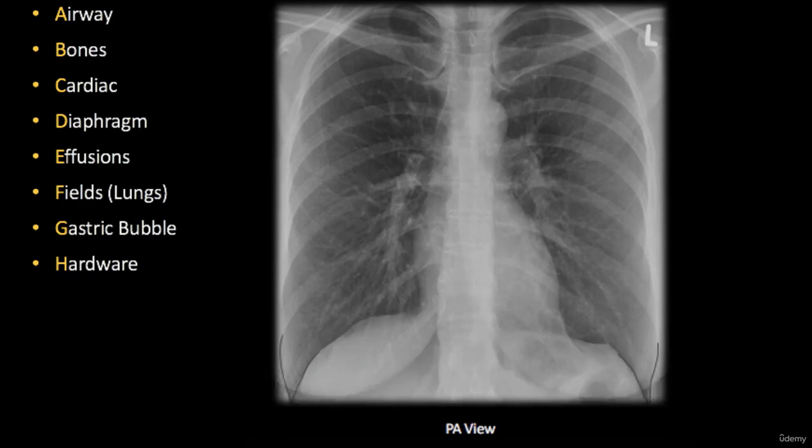Lateral to the dome of the diaphragm, between the diaphragm and the inner surface of the thoracic wall, you can see some angles, two recesses, the costodiaphragmatic recesses. Normally they are kind of empty. We have a very thin film of pleural fluid here, and the lower parts of the lungs slide down here in deep inspiration. So normally we have nothing in there.